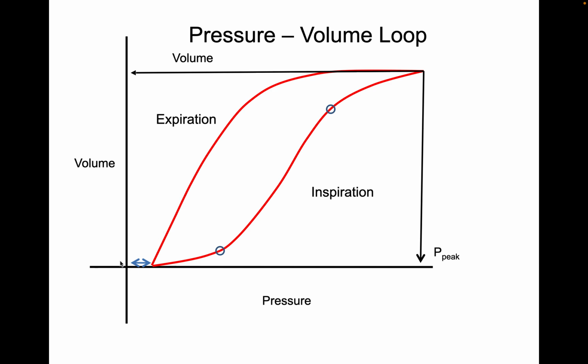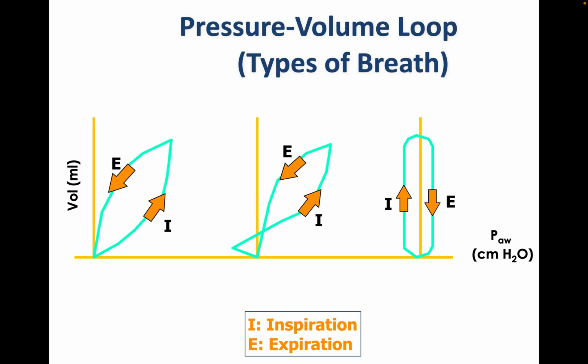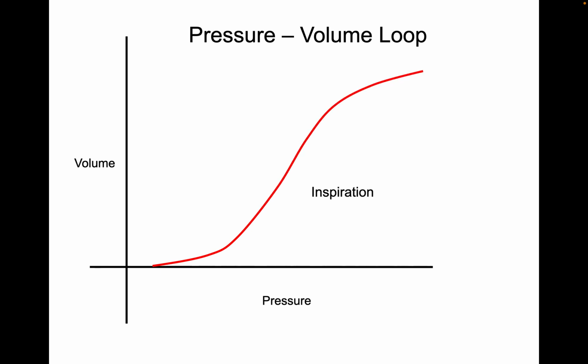And this particular area where the inspiration is starting after some pressure is obviously the PEEP. So this basic understanding of the pressure-volume loop is required.